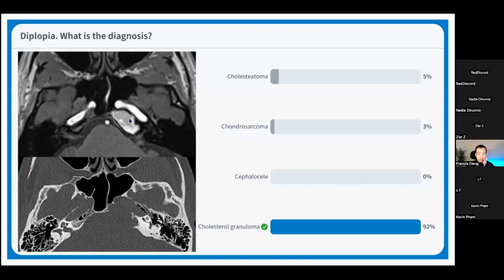And this is basically a chocolate cyst, a blood cyst that over time has accumulated, is unable to drain, and so erodes the bone and can cause expansion-related symptoms to the regional structures like cranial nerve 6, which runs through a small dural canal called the Dorello canal that is immediately adjacent to the petrous apex, and patients can present with diplopia.